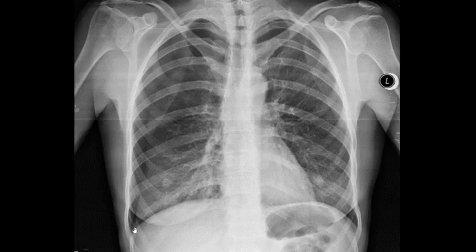If you look closely, from here this line starts and goes up, and you see how it caves in here and comes somewhere here to the end. So this line is actually the visceral pleura. So there is a pneumothorax here. This here is all air, and this air pushed the visceral pleura away from the parietal pleura all the way to here. And this is actually a pneumothorax that has developed.